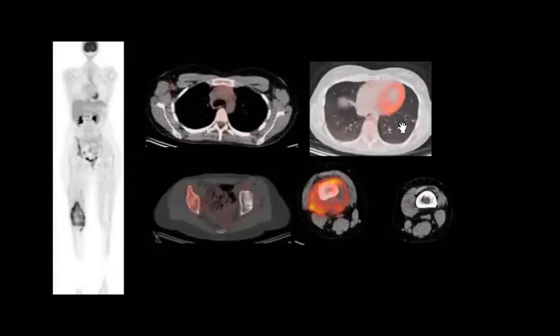Osteosarcoma metastasis to the lung. Lung, with anything more in the thorax? Yeah, lung. Yes. Okay, and lung and the bone. And what? Iliac. Okay, osteosarcoma, I agree. Metastatic. Axillary. The differential may be Ewing, but the site, and I told you that around the knee, so the most important differential will be osteosarcoma.